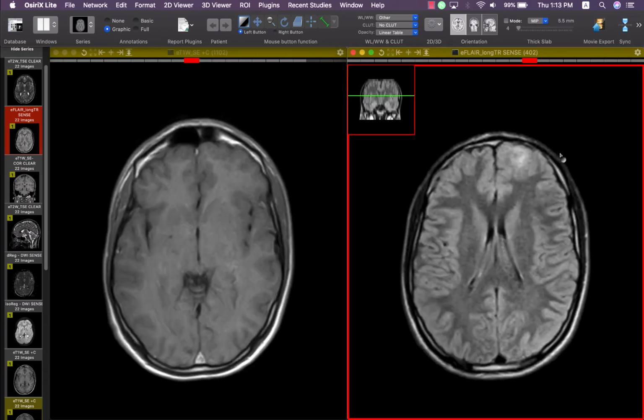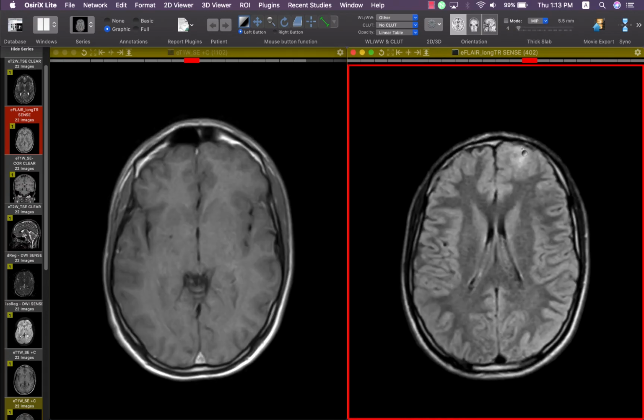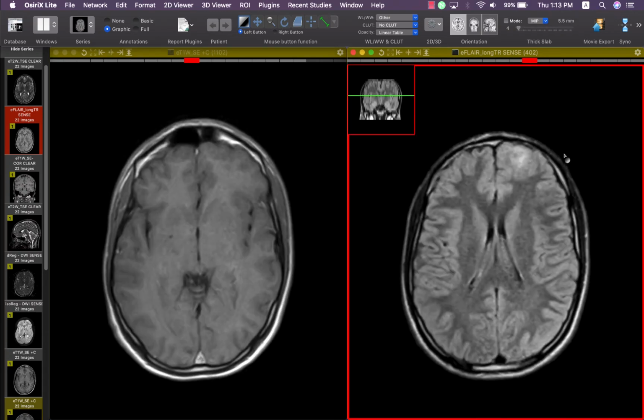Expansion is an important criterion that goes with low-grade glioma. Usually, when a low-grade glioma affects the cortex, it causes expansion or enlargement of the cortices. Here it is not present. So this goes with, sorry, this goes with focal cortical dysplasia. There is absence of expansion, so this favors focal cortical dysplasia.